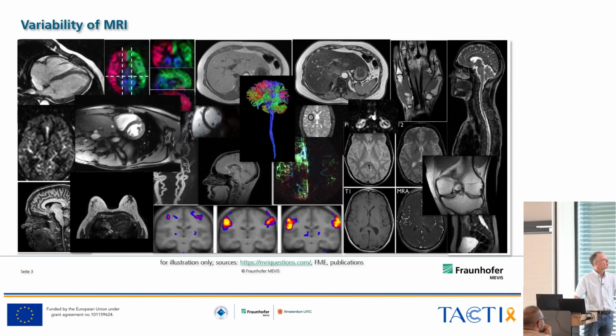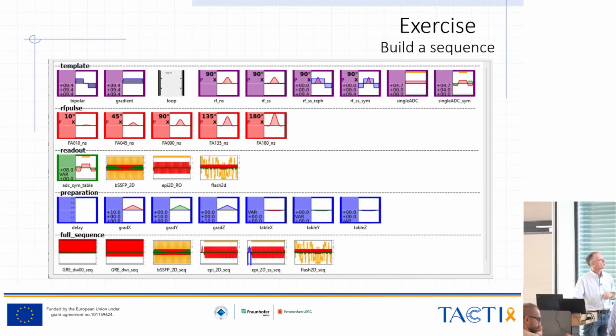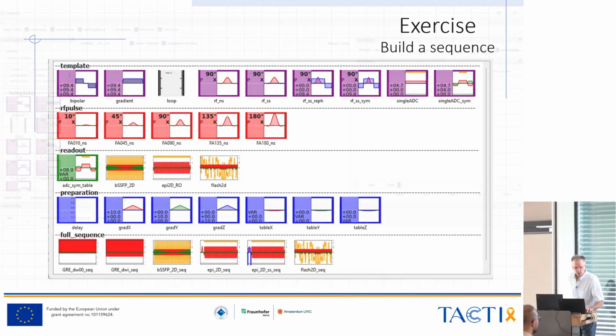So we will very quickly. So those images you already saw, and essentially most of those sequences could be created by just a few building blocks, which I created here. So that's just the complete set of building blocks, which would show up at the start. I also prepared sort of a simplification, which hopefully makes it a little bit easier for you to get started, because it hides some of the functionality of the tool. But let's get started with the tool itself.